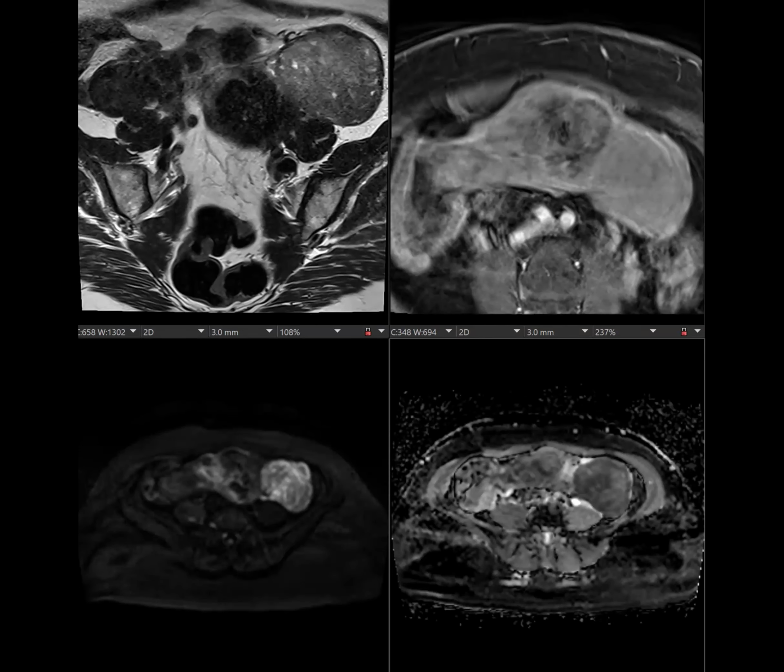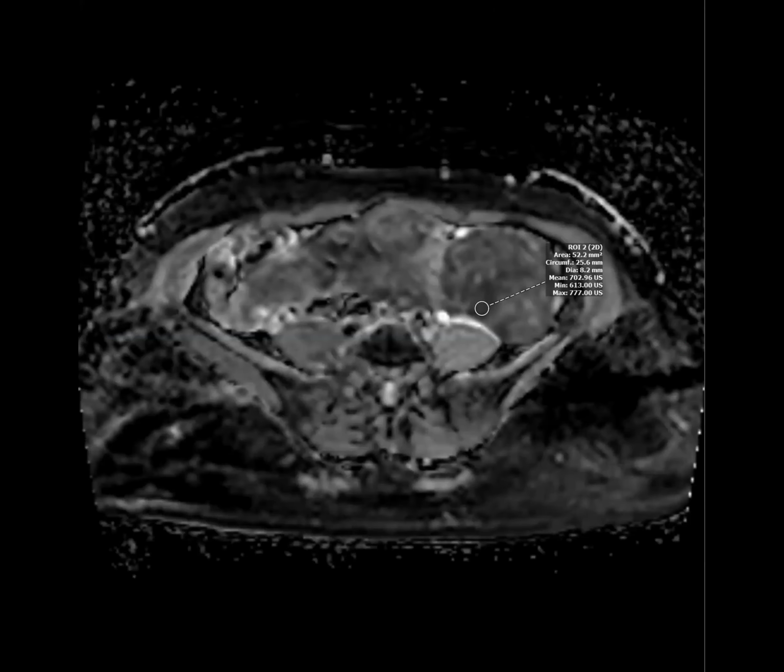I think it's a fibroid. Yes, tell me why. It's very well circumscribed and it's very homogeneously enhancing. And to me, a leiomyosarcoma would not be homogeneously enhancing like that. And fibroids can have low areas. So just looking at the enhancement, I don't even know if I would have gone to the algorithm to say I'm suspicious for an LMS. Because of the enhancement? It's so homogeneous.